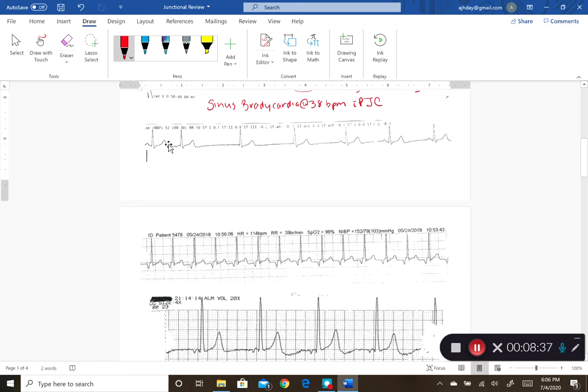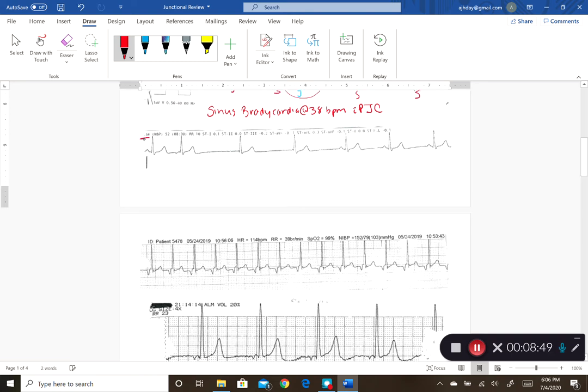All right, moving down to the next one. So looking at this monitor printout, I have a pulse. Pulse is cut off here. The pulse that was detected by the blood pressure cuff was 52 beats per minute. So it's nice, that gives me a nice little readout. I don't have to figure out the rate. But let's look at each contraction here.